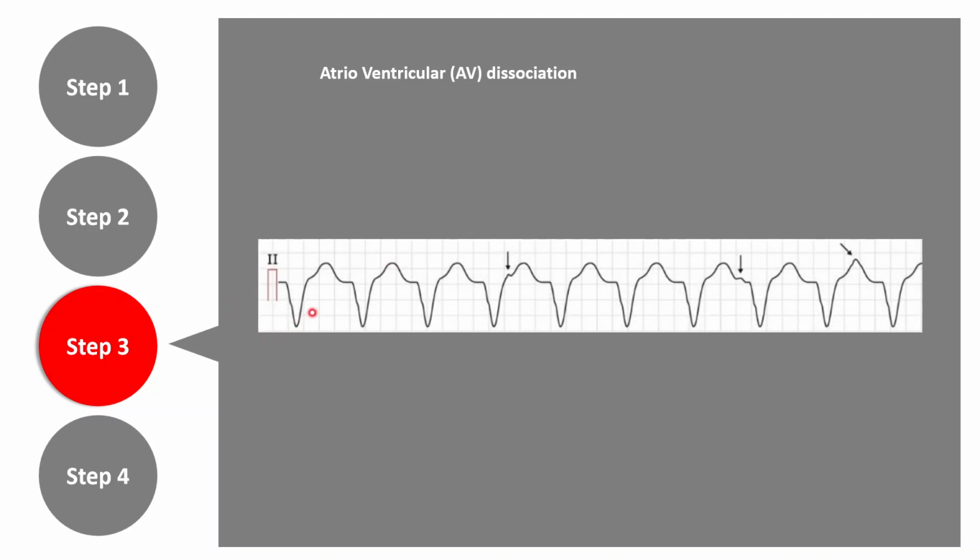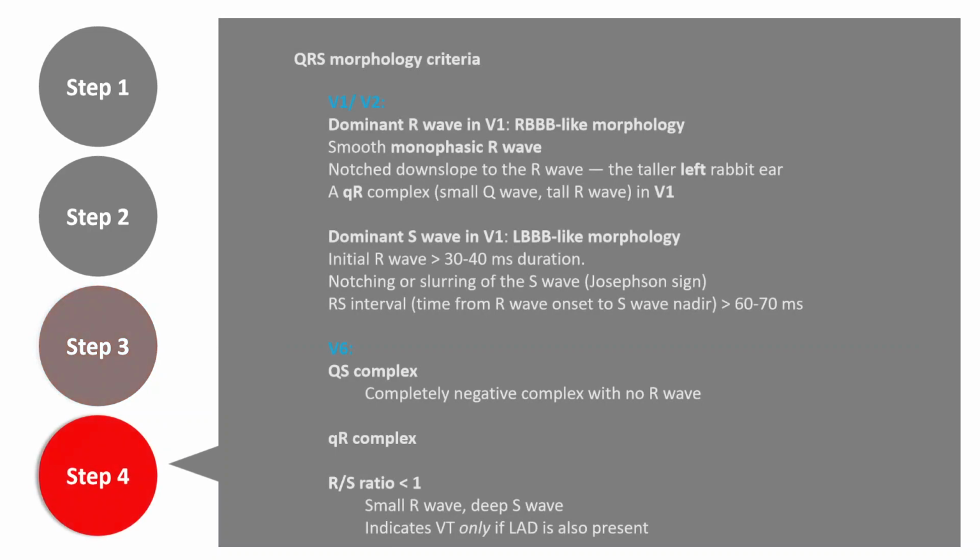If you carefully look at it, wide QRS complex, no P wave before that, wide QRS complex, no P wave, wide QRS complex, no P wave. Suddenly there is a little P wave, maybe. And definitely this is a P wave, right? Sometimes the P wave can be fused together with the T wave, so the T wave will look bizarre. Okay, right. Now the last step.